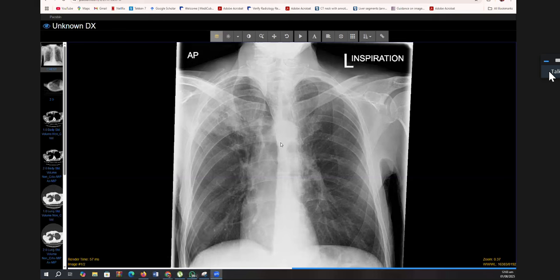So tell me what you think is going on on the chest X-ray. You're having a sneaky look at the thumbnails. Okay, sir. So this is a chest X-ray, frontal projection, of a skeletally mature patient in which I can appreciate an ill-defined opacity with central cavitation in the right upper lobe, with ill-defined spiculated margins. I would quickly go through the surrounding bones and rest of the bones. I can see an erosion along the lateral end of the left clavicle as well. I cannot see any gross erosion in the rest of the bones.